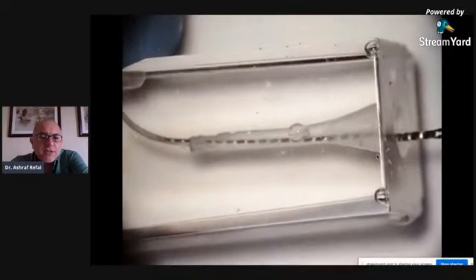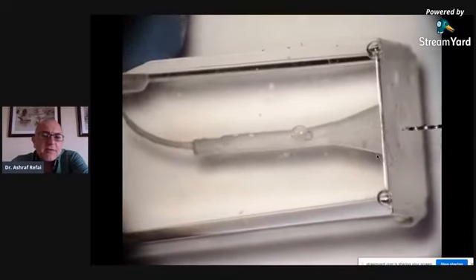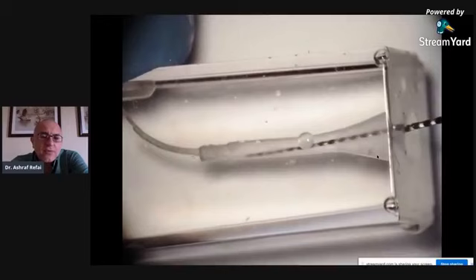Now, the problem, as you see, is that there is an immense amount of damage that has to happen to the wall for you to be able to remove it. And as I showed you in the previous cases, if this damage is in a very thin area of the root, you may perforate. So that's why, again, the treatment of choice would be bypass whenever possible.